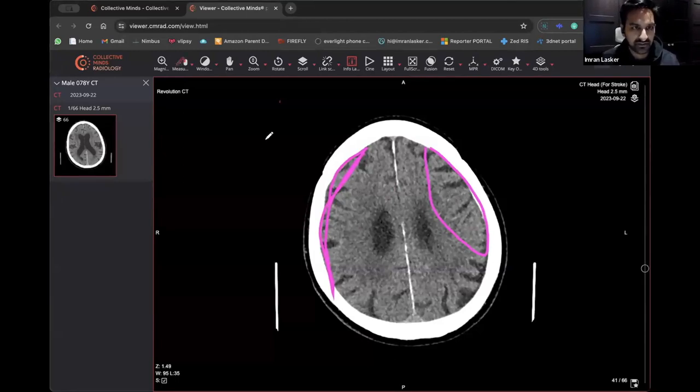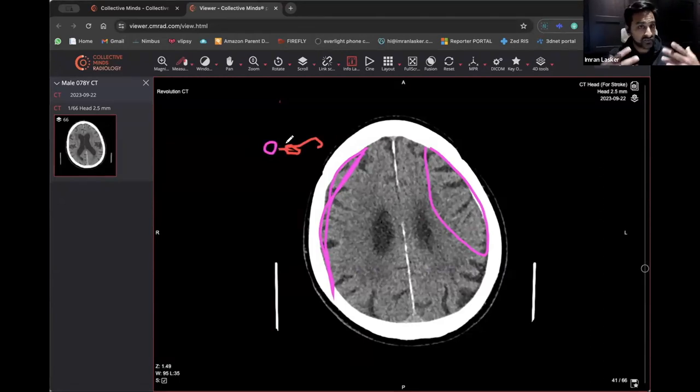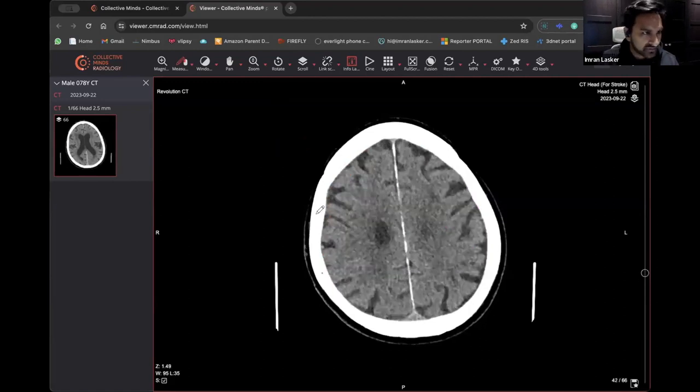So what I end up doing is using a different way. If you've got a pair of glasses, like this, I can't even draw them on here right now. So a pair of glasses like this. Someone who's got glasses needs an extra pair of lenses for extra eyes, and therefore this would be a subdural, extradural. So extra eyes is a lentiform, a lens shape, which would be an extradural, and the opposite would be a subdural, right? A few people have said they can see it.